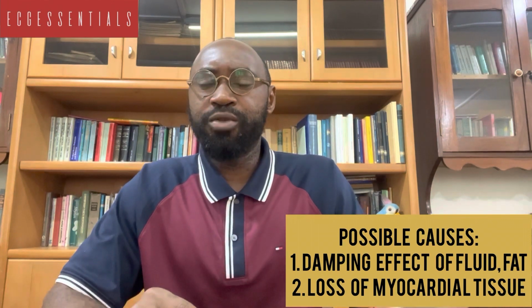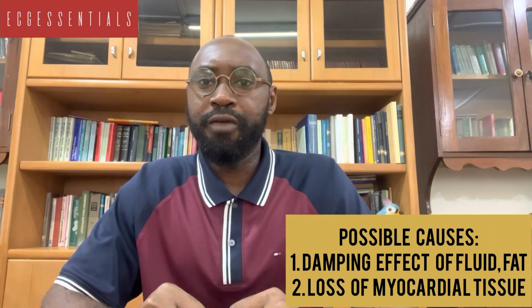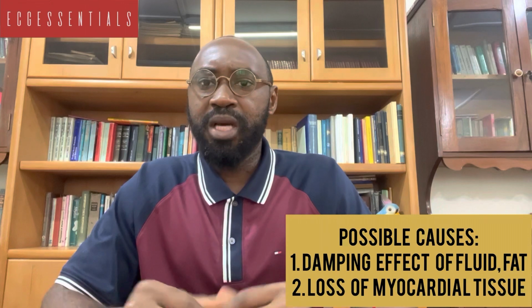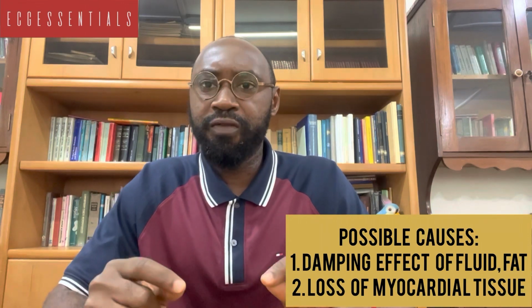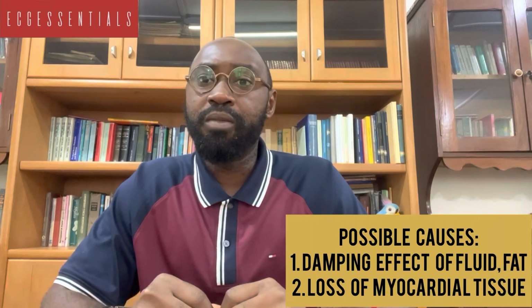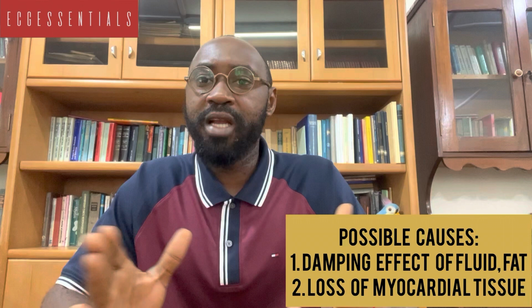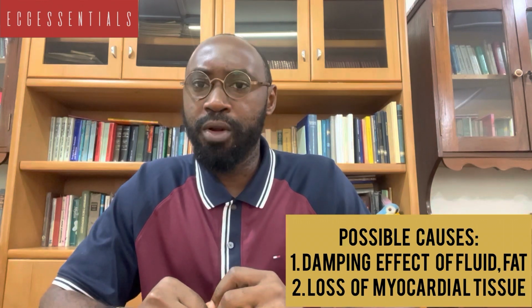So with respect to, say, the damping effect, if we have a massive pericardial effusion, because of the presence of that fluid, the conduction of the electrical activity to the recording electrodes will be impaired, and so the voltages may be low.